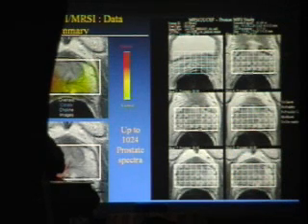This is the way the data is acquired. And your technologists need to learn where to place this grid, and once they figure that part out, it's actually relatively straightforward. One of the things that's important is to try to avoid contamination by air or contamination by fat around the prostate itself, and you want your voxels clearly to be centered on the gland. And then you simply analyze the spectra from each of those little boxes.